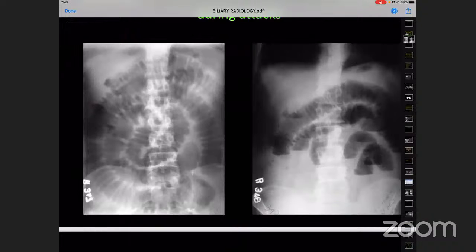These are obstructions of the distal end of the jejunum, because you can see the concertina appearance. The bowel loops are small bowel obstruction, because as you can see, they are situated around the midline. You can see the beautiful step ladder. These are jejunum because you can see the concertina.